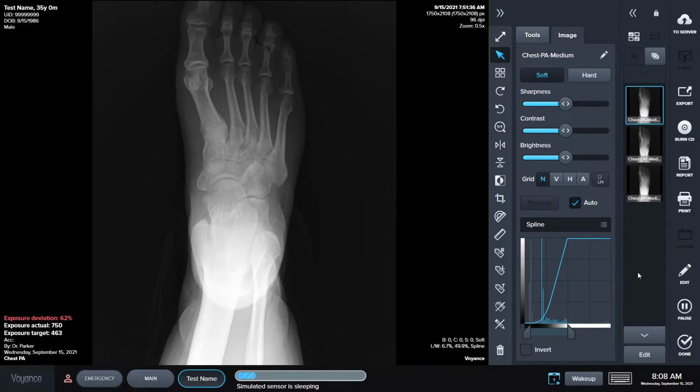On the all the way right hand side, you see some more tools. You have the Send to PACS node tool. This is the remote PACS node. So that's handy if you need to send it off. You got an email button that's not highlighted because it's not configured. I will go over that later.